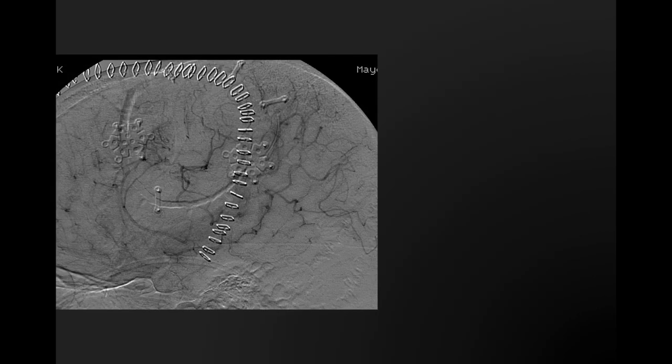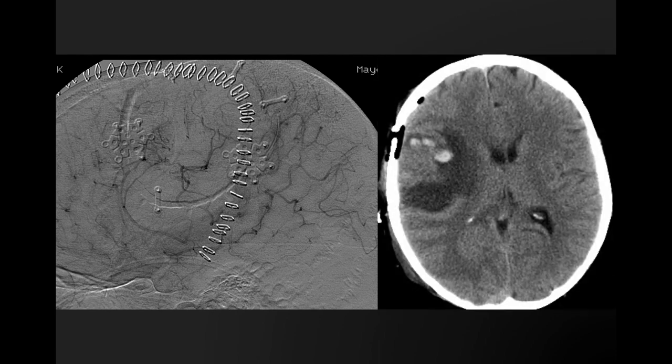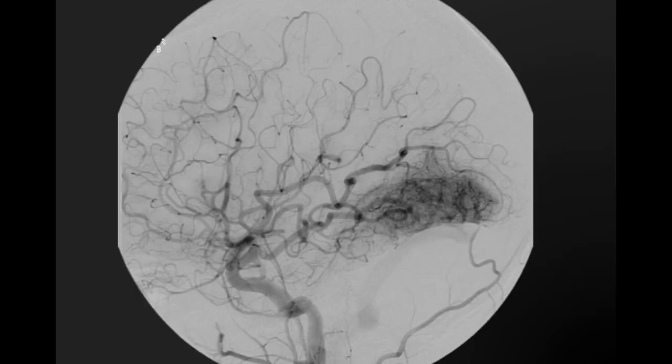And the patient got surgical resection of the AVM, and then the patient had a large venous infarct, and this is actually probably due to the fact that this AVM had bled, right? But there was already slow flow in this DVA that was draining normal brain, and then we resect the AVM, and you can possibly get thrombosis of the other radicals that we weren't seeing draining into the DVA, and that's probably what caused that venous infarct.